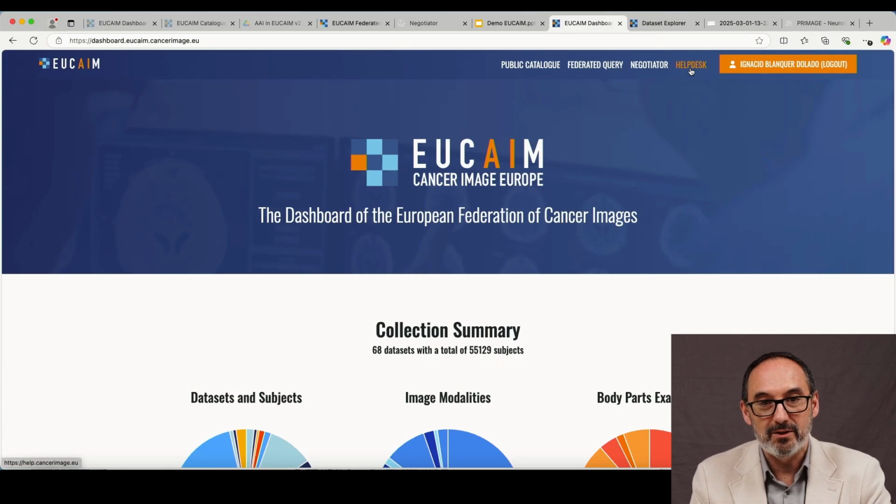So that was the main outcome of the platform. You have seen the whole process from discovering data, requesting access, up to actually accessing the data in our platform. There are many other points of information, and I will point out just a couple of them that we consider very relevant. Let me go back to the dashboard, and as I told you, there is a help desk system in which you can get support, even if you are not a user of the system.